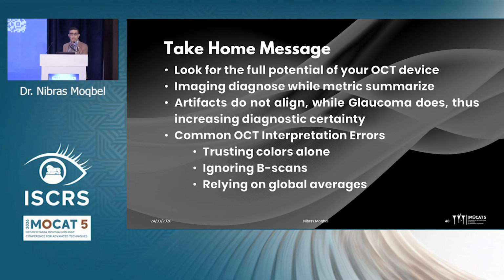For artifacts, they don't show topographic agreement. Artifacts don't align. Glaucoma damage aligns. And if you have alignment, we are increasing the diagnostic certainty of our case.